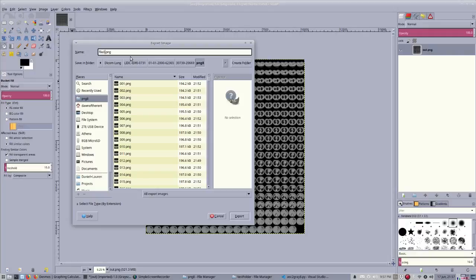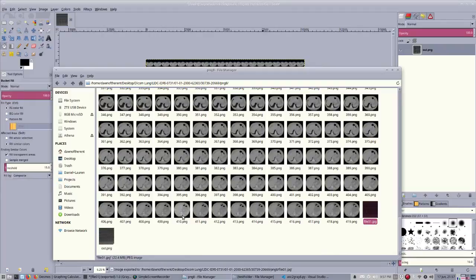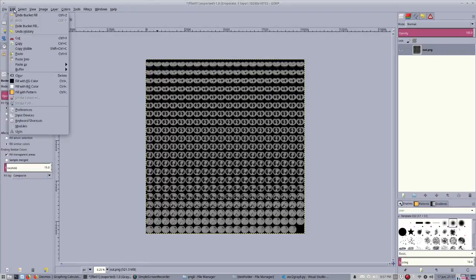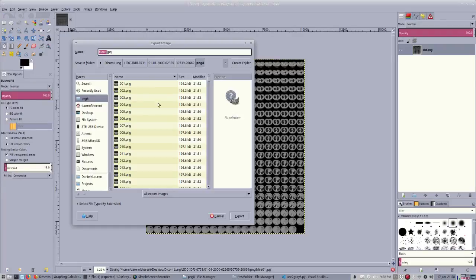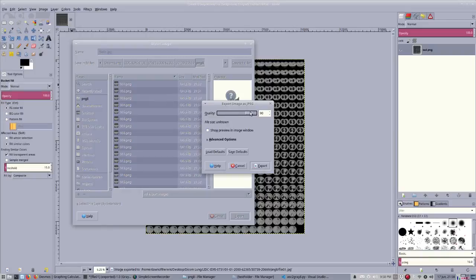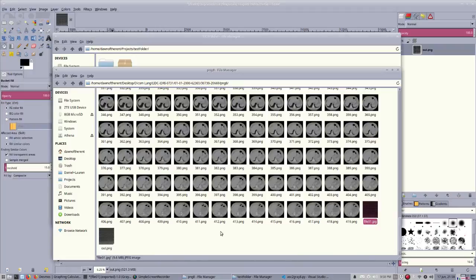I'm going to replace file 1, and I want it as a JPEG because I want it to be smaller. Let's see what a 90 quality level gets us. Okay, so 22.4 megabytes, that's still too big. A lot of the free hosts won't let you have bigger than a 10 megabyte file. Fortunately, JPEG is a pretty decent compression for grayscale images, so we can compress it pretty heavily without getting too many artifacts. So let's drop it down to 60. Okay, and 9.6 megabytes, that's good.